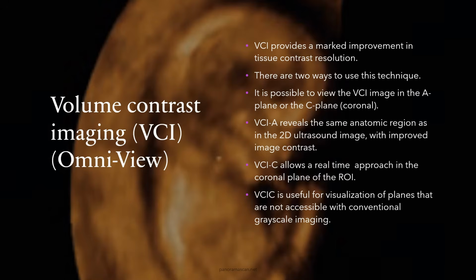OmniView is invaluable in fetal imaging, vascular studies, and organ evaluation. Its ability to improve tissue contrast and provide multiple viewing planes allows clinicians to make more informed diagnostic decisions.